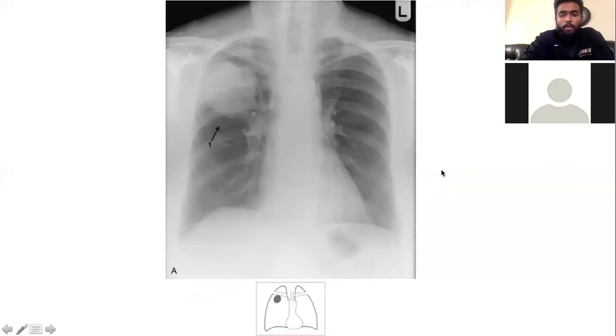Okay, so on this one, this lesion, where do you think it is? So first, obviously, right or left lung. That's the right. So that's right upper lobe, I think. Why is that? I don't know, even without the hilum, to the fifth, edge of the sixth rib, there's nothing really much more above that. So I just feel like that's right upper.